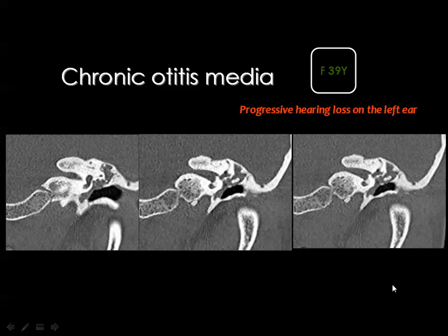Both do not enhance and they depend mainly on the presence of some air within the middle ear cavity to look for the dependency of the fluid. Then you are dealing with otitis media. If the lesion is non-dependent, then you think immediately of a cholesteatoma.